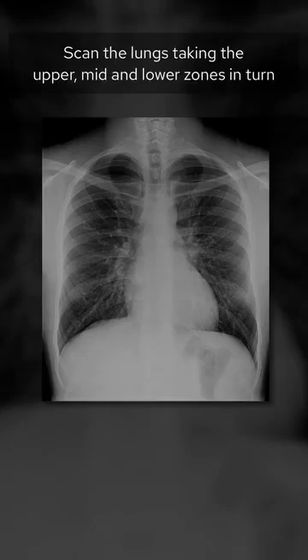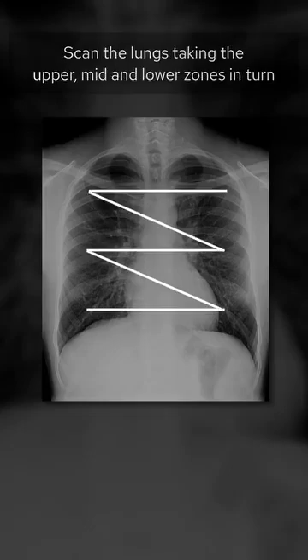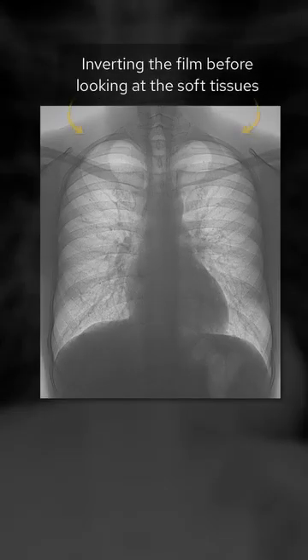Scan the lungs, taking the upper, mid and lower zones in turn, then give yourself another chance by inverting the film before looking at the soft tissue.